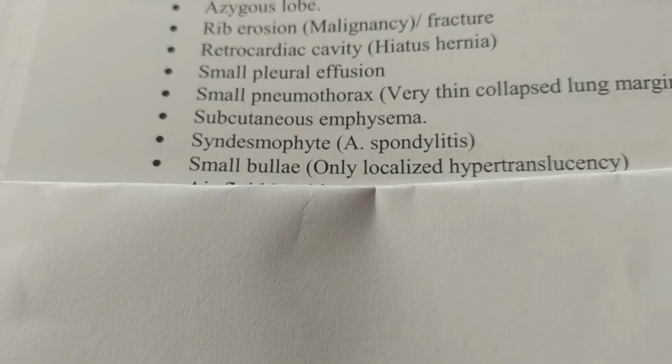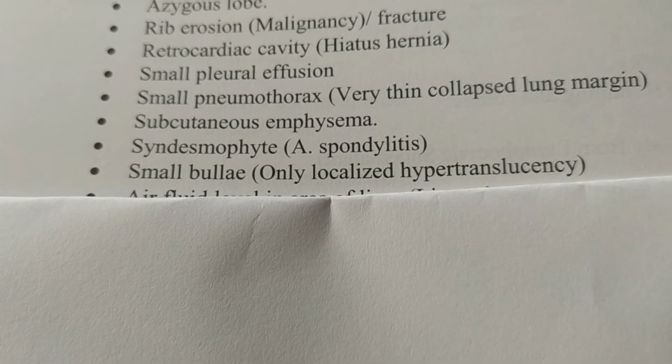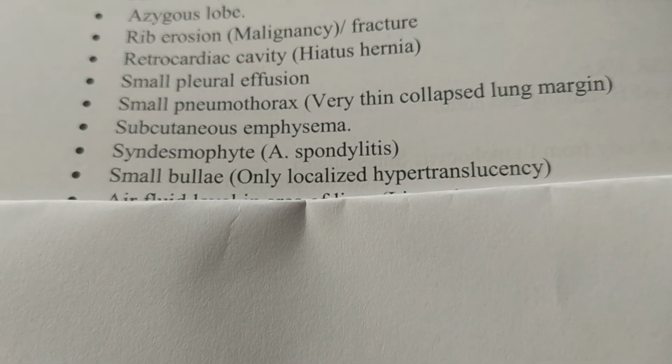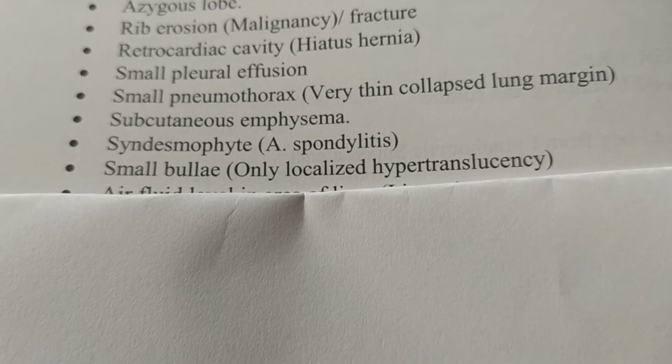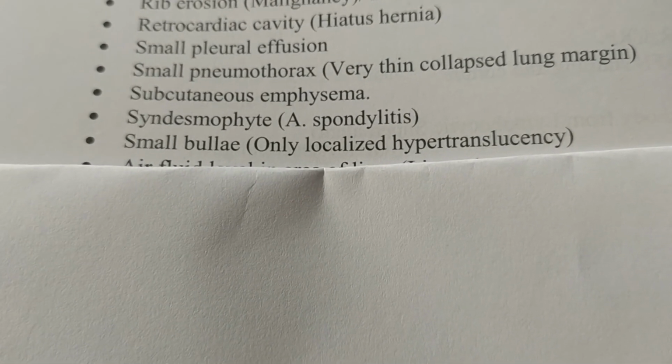A small bulla is another point that can be undiagnosed or missed on chest X-ray. It appears as a very small localized hypertranslucency.